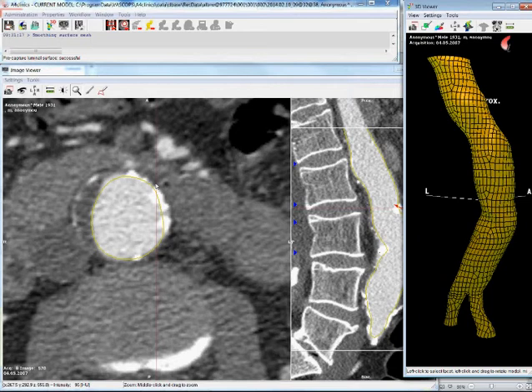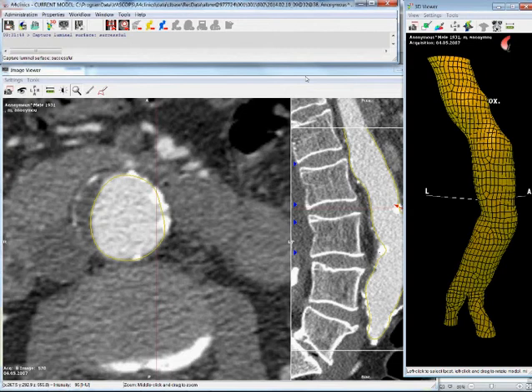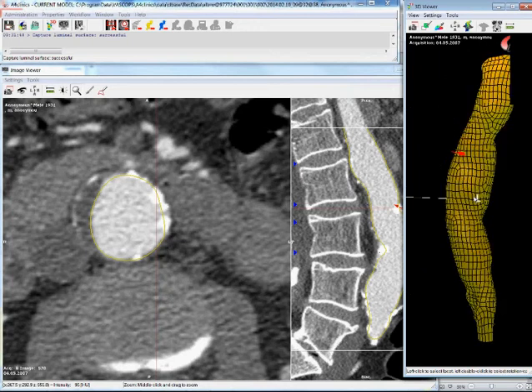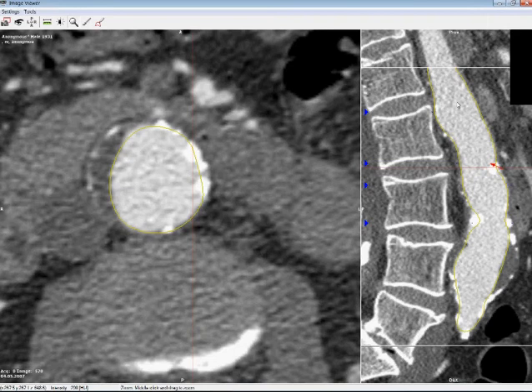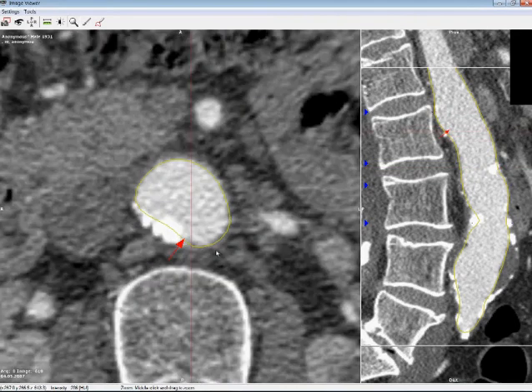In the next step, this representation can be refined simply by using this balloon model, which is not limited to slice information, but also considers the whole three-dimensional information. Now you see, in this case, the result didn't change a lot. We can then also go through our case and see what this segmentation actually provided.